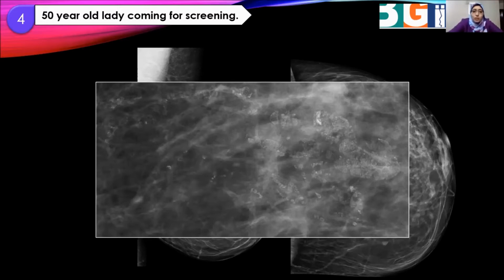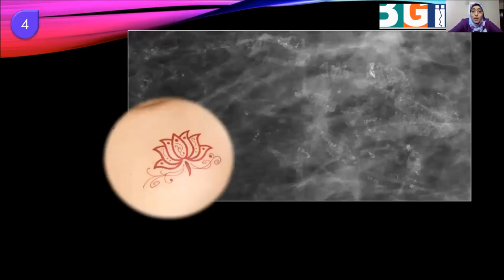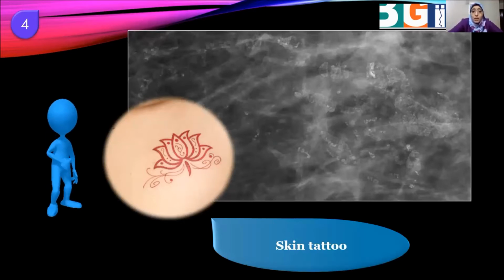After investigation, we found that the patient had a tattoo, a skin tattoo. So it is very important to include skin lesions in the differential diagnosis, because they may be misdiagnosed as pathology. This is not a picture of malignant microcalcification, it's a skin mark or skin tattoo.